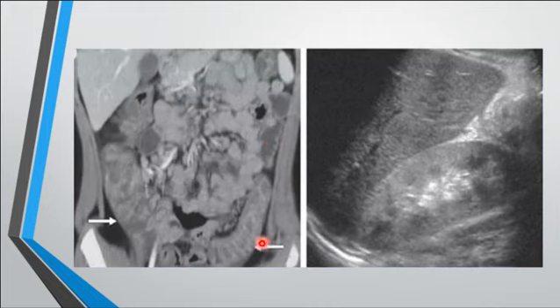So the descending colon shows diffuse wall thickening, okay? With an echogenic enlarged kidney, what does it equal? The colon is involved, abnormally thick, plus an enlarged echogenic kidney. What does it equal? Reaction to transplantation, for example. Possible, like graft versus host disease is a possibility. What else? Blood disease, okay. Like what? Sickle cell? I'm not sure it has any.